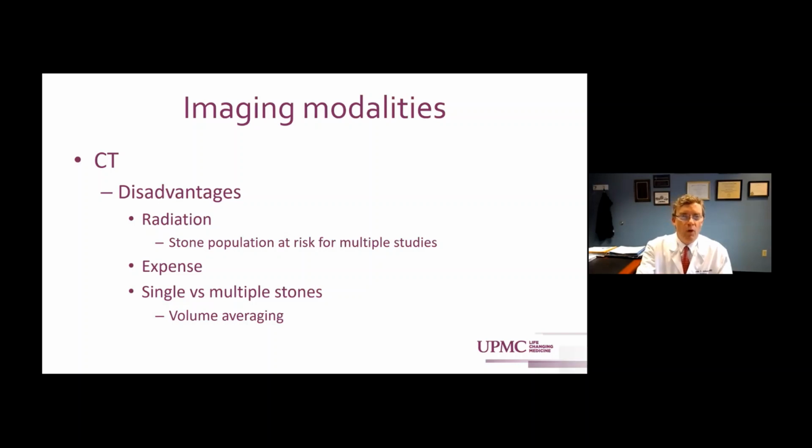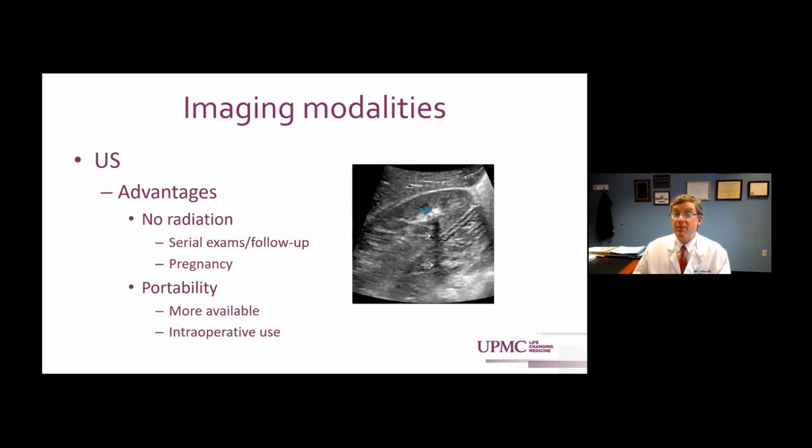And one other minor thing I'm going to point out is the single versus multiple stones. Sometimes you volume average between the stones. You can't actually tell that what you're looking at isn't just one big stone, but instead it's actually a collection of single stones. And you can almost sometimes see that better on a plain x-ray. So the rest of the modalities I'll go by quickly and just talk about advantages and disadvantages, mostly with respect to CT scan.